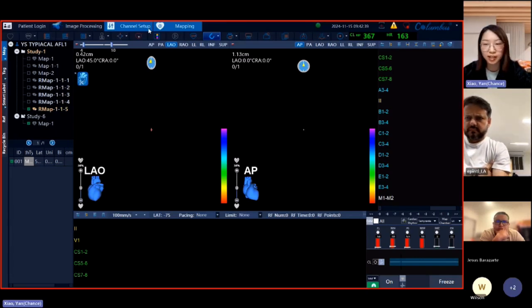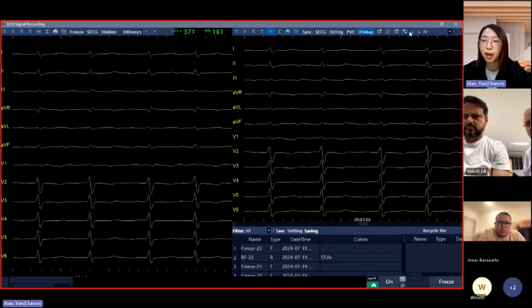It's fixed and we cannot change it. And if there was noise from one channel, we could do nothing on the previous version, but now we can. So I will show you.